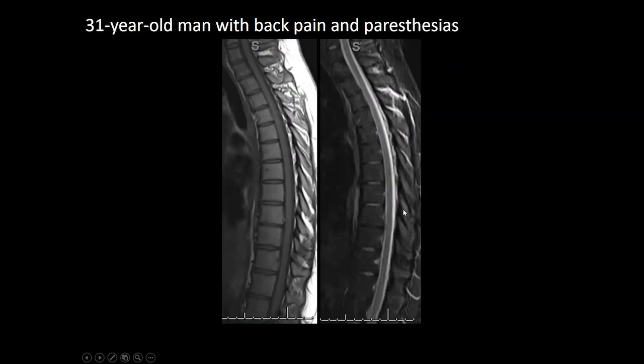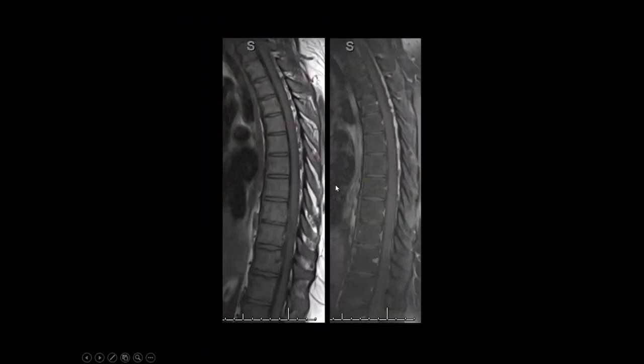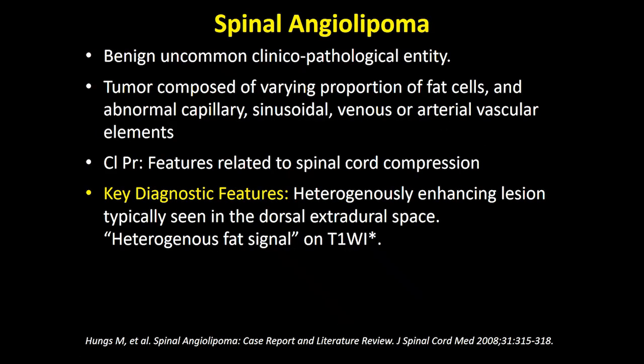In this particular case, it is not being effaced, but I see abnormal signal being present there. Also, on my T1 weighted images, there is heterogeneous signal seen in the dorsal epidural fat. Upon contrast administration, there is enhancement seen in the fat suppressed contrast enhanced images in the dorsal extradural or epidural space. Diagnosis in this particular case, therefore, will be a spinal angiolipoma. It is a benign, uncommon clinicopathological entity.